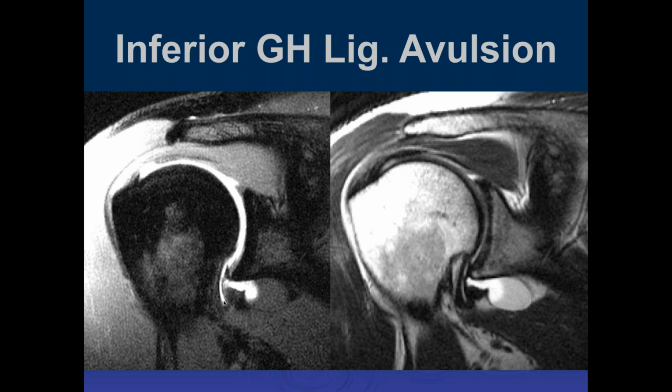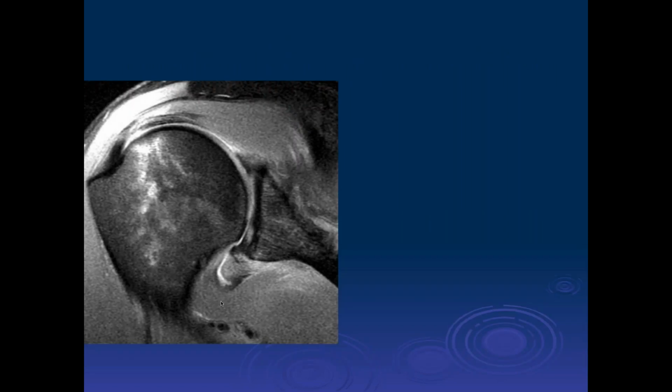Okay. Yeah, the capsule stops here. This is all labrum, periosteum, and potentially bone in this area, but usually it's not bony. This is usually just all labrum. Thank you. Thomas, what do you think of this one?